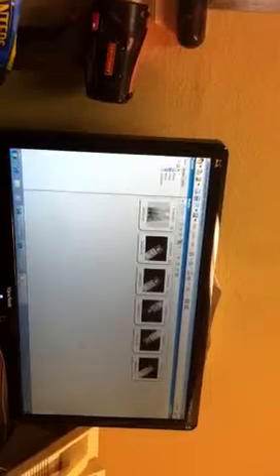Patient name, don't even open the record, and you can just go into taking X-rays. It's that fast. So now here you can type in the patient name, and it'll filter out. As you're typing, last name or first name, it'll filter the list. Or you can just double click. If you see the patient name, you can double click. Now you're in the patient record.